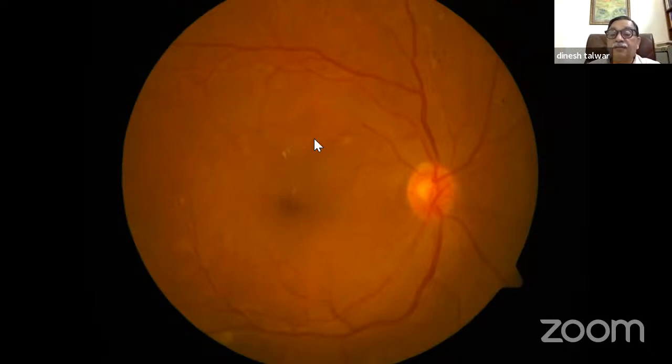Could you laser it then, this microaneurysm temporally? That would be some sort of a grid laser pattern. No, why? Just the top half, one microaneurysm, maybe another one on this side, and possibly another in the middle over here. 3 microaneurysms. Why do you need a grid? Focal laser over here. Can you do focal laser for this area?